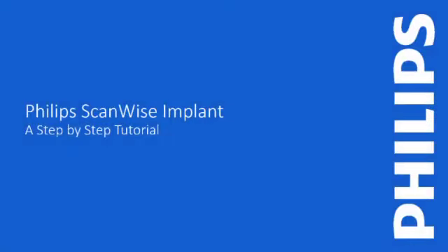I would like to welcome you to a tutorial on Philips ScanWise Implant. This is a step-by-step tutorial on how to use this product. Philips ScanWise Implant has been around for many years. I want to show you how easy it is, though, to scan MR conditional implants using ScanWise Implant.